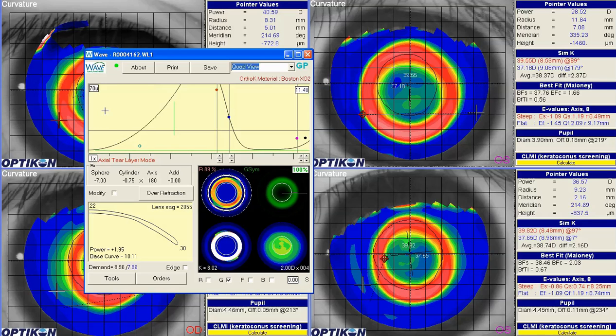I don't think it's really 0 at this point. All we're doing is flattening the lens a little bit. That's not a huge change. If we want, we could lift the bevel a little bit more just to flatten out even more and see if this lens might ride up a little bit higher. We can also increase the OZ a little bit by adding shape factor to the lens. So if we go down here and add, for example, I usually go with a plus 20.